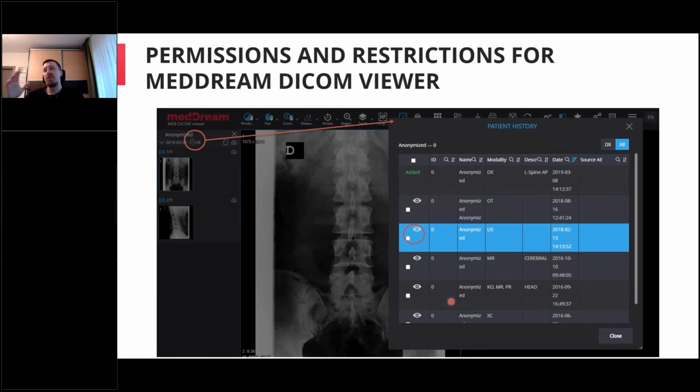Sometimes you don't want to have this functionality, and you think, I will make a study integration by study UID, and that's it. But if you forget to remove patient history from the permissions in the system JSON, this information could be visible, and some doctors or other users might not need to see other studies for that patient, only that particular one.